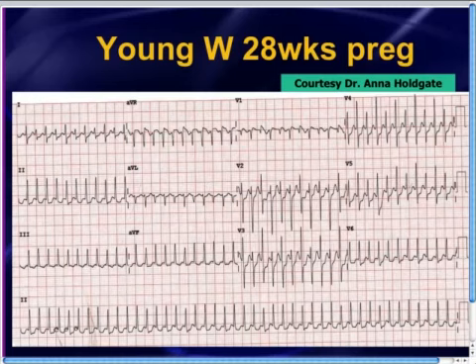All right, second point that I want to make here is you'll notice that in the lateral leads especially, you've got ST depression. Some people might say, oh my gosh, maybe this person needs a stress test or needs to be worked up for the ST depression. It turns out that when that has been studied, ST depression in the setting of SVT has no clinical significance.